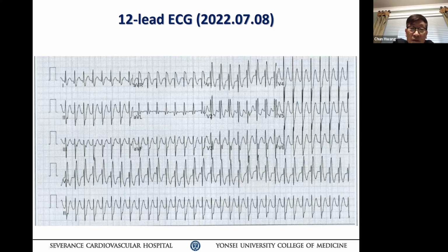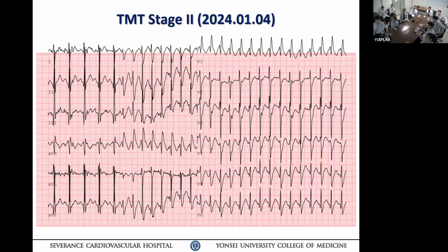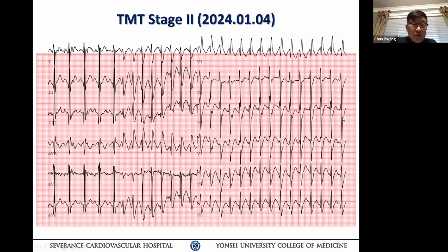오케이. 그러면 그 당시에 어블레이션 successful 했다고 그랬어요? 이때는 unsuccessful 했다고 나와 있고, 그 다음에 최근에는 12월이 successful 했다고, 네, 오케이. 12월 달에는 어블레이션 하시고 인덕션 안 되는 거 확인하고 시술 끝나셨는데, 3일 뒤에 재발했습니다. 오케이. 그래서 본원 내원에서 TMT 시행하면서 다시 유발이 됐습니다. same tachycardia. posterior fascicle, right?